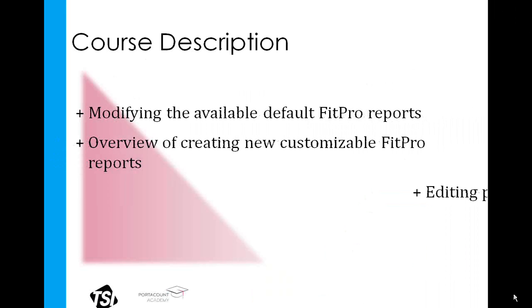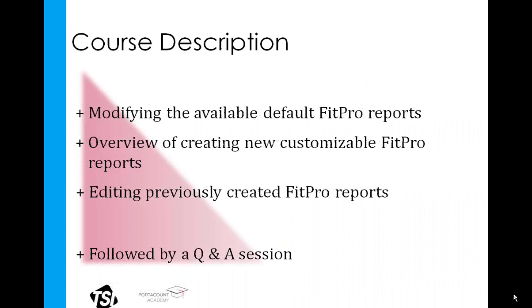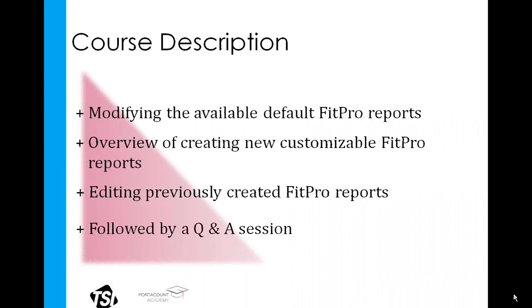In this course, we're going to be discussing the reporting functions available through the FitPro software. We'll discuss the modification of reports, default reports, and the modification of user-created reports.